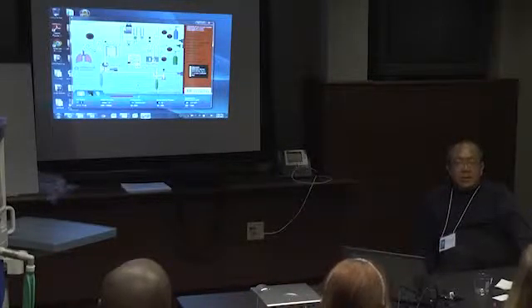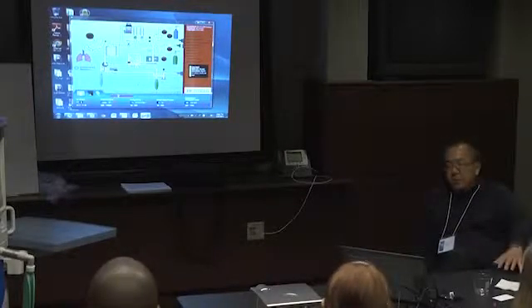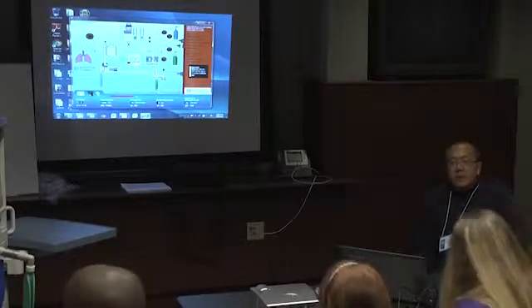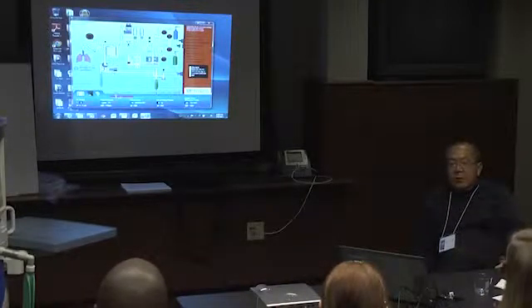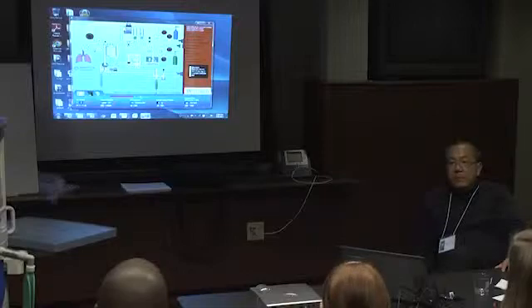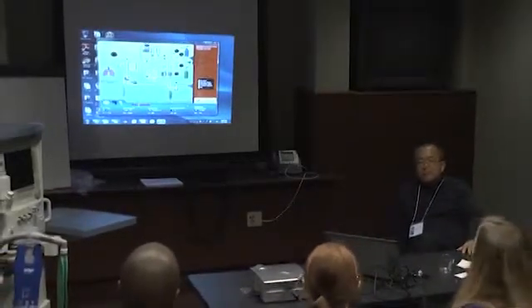A little less than 2 hours, 110 minutes, right? Okay. How you round it up, that's fine. So you think you have 2 hours. What if I tell you you really don't have 2 hours? Well, because it's driving the ventilator too. Very good.